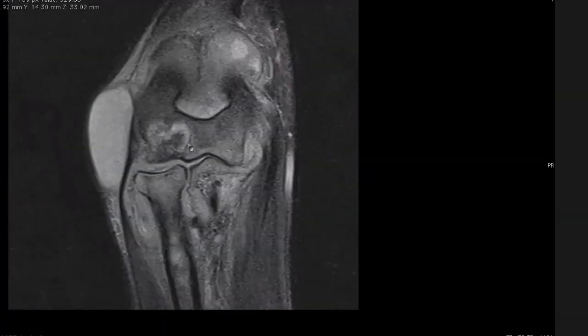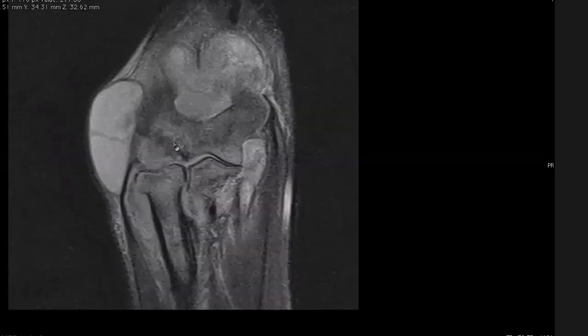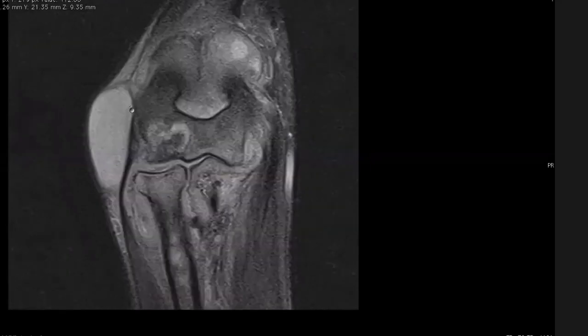And the other thing, probably on this one I can show you better, is that's a Brodie's abscess. We were saying Brodie's abscess. So this is how Brodie's abscess will look, right? We have a focal enhancing, eroded lesion here on this T2 fat suppressed image, and then you've got this edema. The other thing is sinuses. TB, as you know, forms sinuses, right? So that's a collection in the subcutaneous fat, which communicates with the joint.